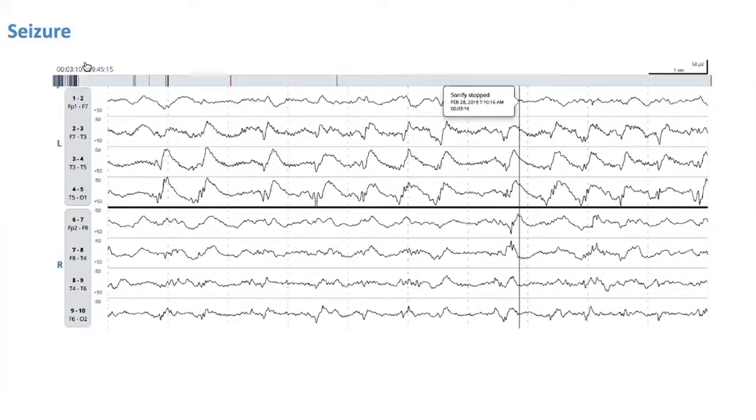Yeah, this is very important because in discussions when we talk about parasagittal and midline seizures, if something is a seizure, usually it will create such a big field that you will be hearing the explosions from elsewhere as well. So it's never remaining precisely very, very focal. If it remains extremely focal, it may not have the big energy to generalize to other sides of the brain or other areas of the brain. And usually those are not the ones that cause severe altered mental status.